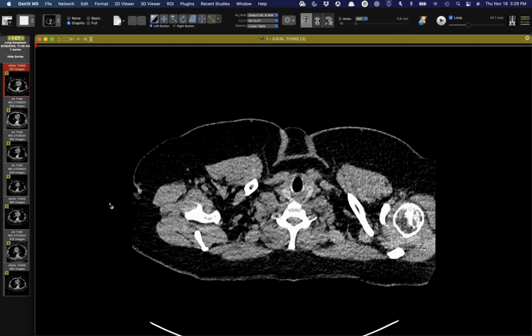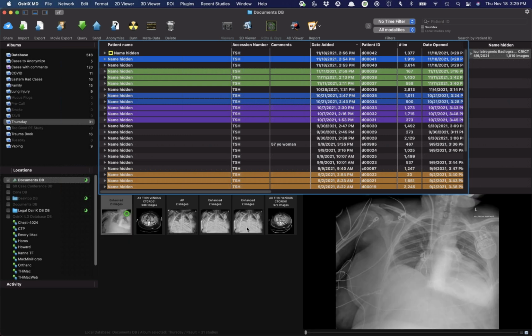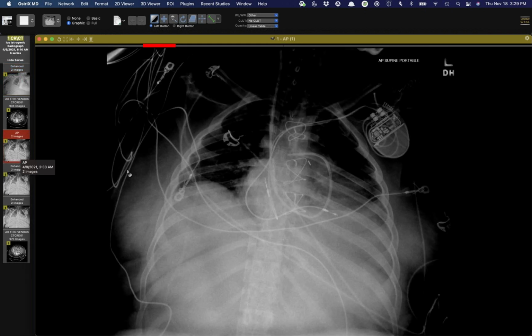Go ahead. I think the marker's a little bit shorter. That proximal marker is shorter than the one that's at the tip. And then, some of the ones have a fainter extension past the dense marker that tells you that's really the tip and not the proximal marker.